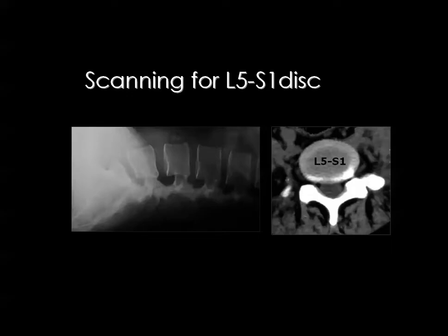Then we come to the L5S1 disc. You know that the L5S1 disc is carrying the body weight until it is divided into two halves on the sacroiliac joints. Then this disc is suffering every time, and it's allowed for the L5S1 posterior border to be convex like this, and you consider L5S1 normal at that time.